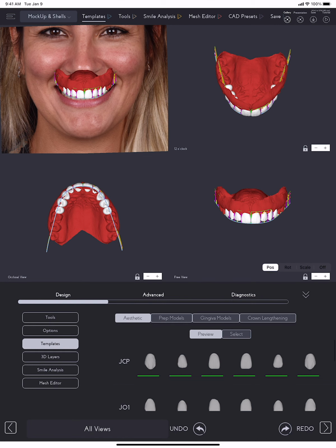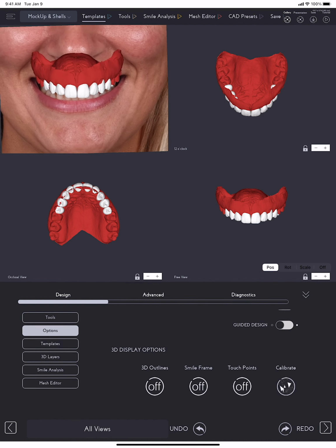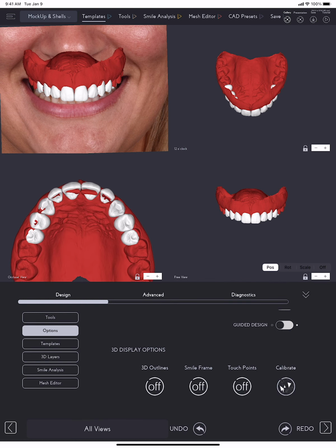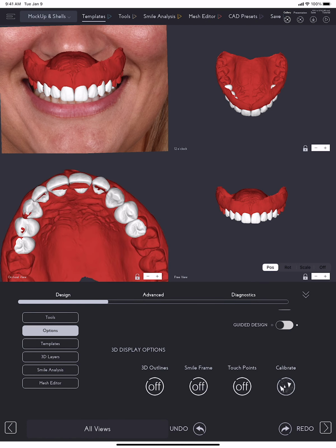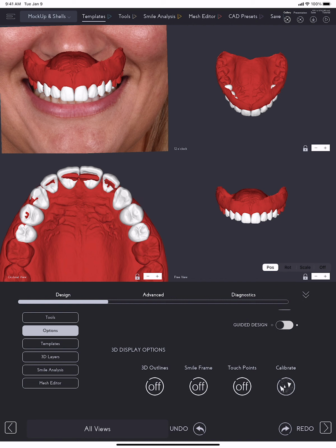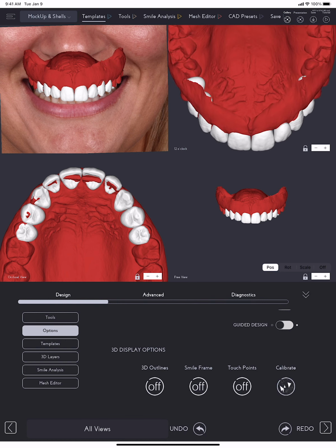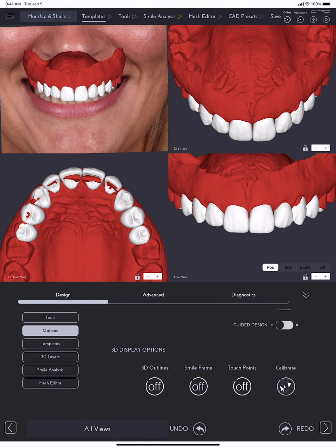Good. So first of all, we need to select our templates. Which template do I want for my patient? But first of all, let me make sure that all 4 screens are properly set here, like occlusal angulation, the 45 degrees from the top view, and this one.